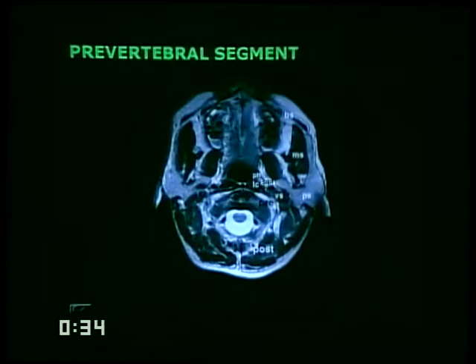In the prevertebral segment, you have an important muscle called the longus group of muscles. Depending on where exactly this is identified, if it's in the head, it's called the longus capitis. If it's in the neck, it's the longus colli. And there's also the longus obliquus. Again, detail that is completely unimportant, and it actually takes more time and space to spell them out than to actually look at the length of the muscle.